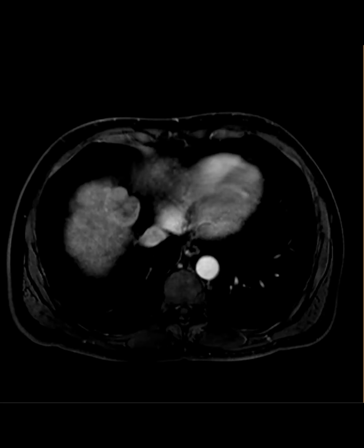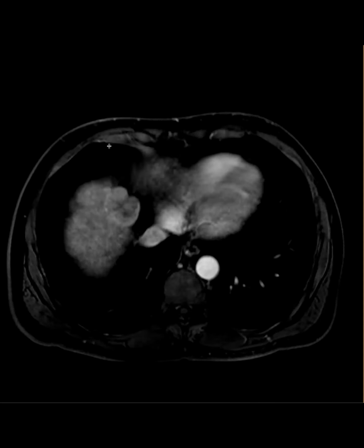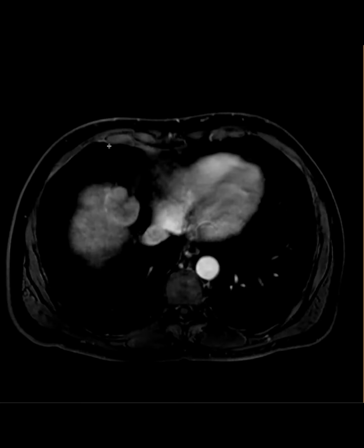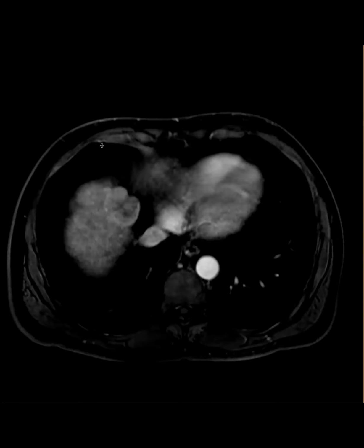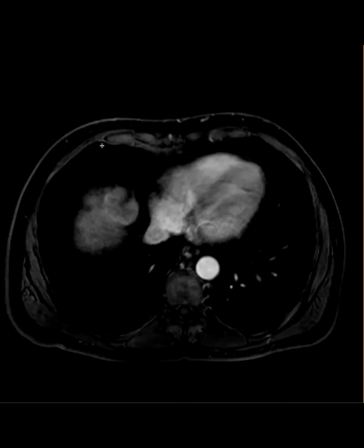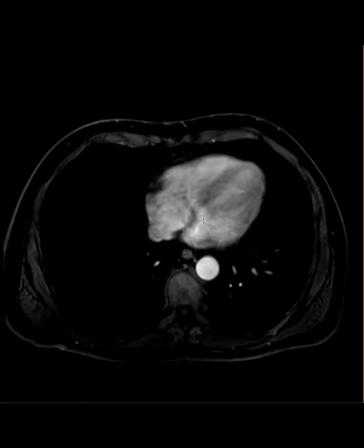That's why I asked Nelly to scroll up and down and see what it looks like. Sometimes you can get one slice that sort of looks like it, but as you go up and down, you see you just caught one area. Here, everywhere you look, most of the enhancement is in the periphery, and however she scrolls, the periphery invariably enhances more than the center.